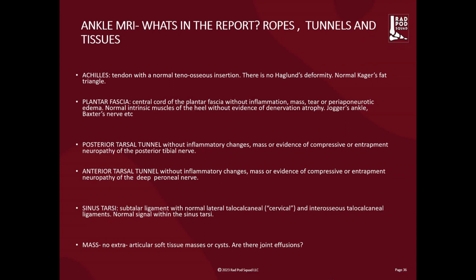To create that report, we're going to assess multisequential, multiplanar MRI anatomy. And we can invoke checklists and patterns that can help us to assess the pathology.